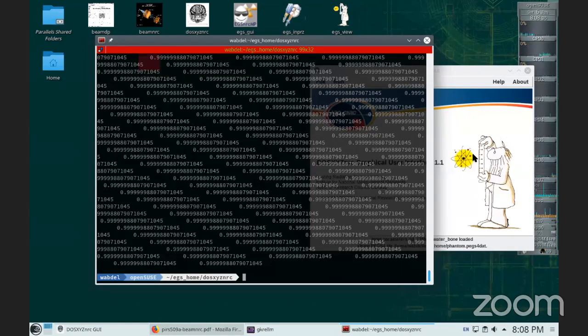It will read the DICOM RT, convert and read the CT data, read the beam parameters, create an input file for your beam, and send everything to the EGS installed on a computer, run the simulation, and when the simulation is done, it will retrieve the results. You can get the dose distribution. It even calculates DVHs. This one does not calculate DVHs.